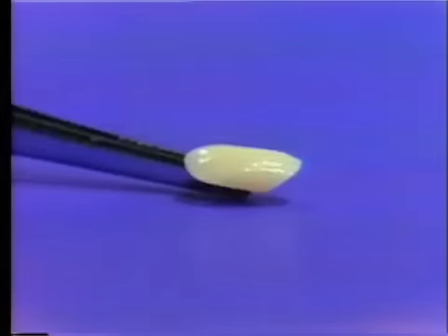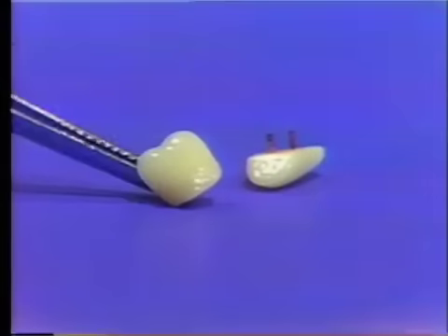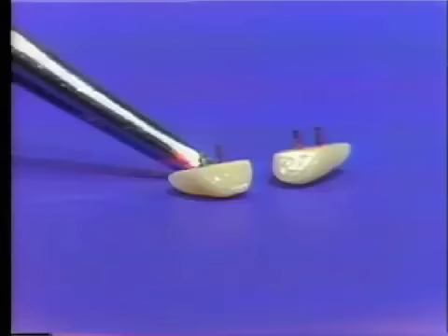Here is another long pin facing, this time for a cuspid tooth. And this again is characterized as for a cuspid on the labial surface. The lingual surface has the two pins which are used to give attachment to the gold backing which is developed around this. Here is yet another long pin facing, this time for a molar tooth. And you can see the development of the two molar cusps. It similarly has two pins on the lingual surface for attachment to the backing.